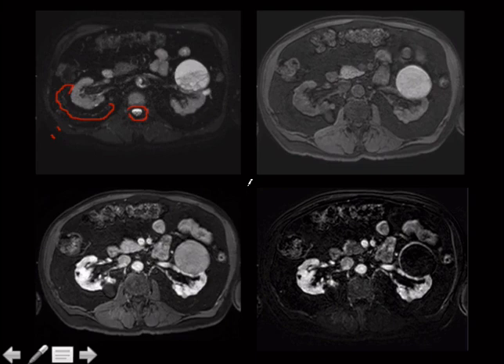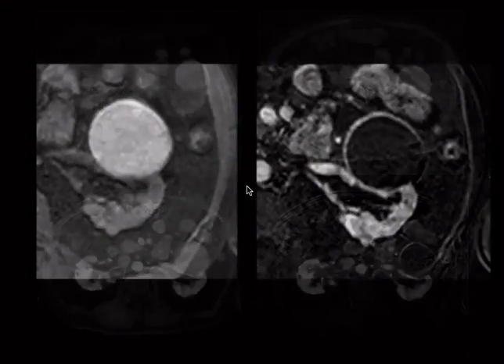Also pay attention to, this is a really quick way to do, is this a fat-containing lesion? Look for a non-fat saturated sequence and a fat saturated sequence to just immediately tell if that thing has fat in it. Another basic gamesmanship tip that we talked about in the liver module, which is there in and out of phase imaging? If there's in and out of phase imaging, and they've provided that for you, more than likely it's a question that revolves around the presence or absence of fat.